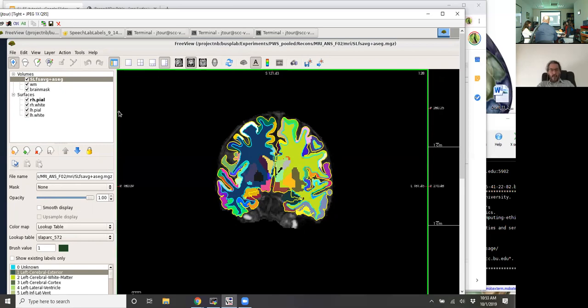Well, if we want to make it compatible with the way our FSL pipeline works, we could just add a text file with the same name as this MGZ file that contains just the labels, just a copy exactly of the text file that has been used to generate the text files containing the list of ROI numbers, ROI names, and RGB values. So basically, just copy the... Right, that would be very handy.